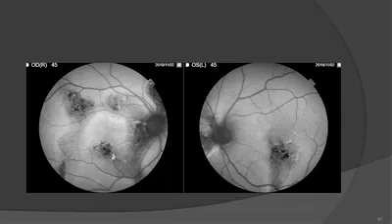But to be sure, because the treatment approach in both cases is not easy, it could be a case of posterior uveitis versus a case of chronic CSR. And one of the differential diagnoses in my mind at that time was Harada disease, in spite of the absence of optic disc edema, but it could be an early case of Vogt-Koyanagi-Harada.